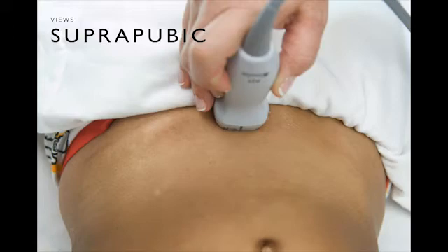So I add in this because I had mentioned this briefly when we talked about the cases yesterday. I wouldn't solely do a Morrison's view in a kid. So even if a kid has a liver laceration or splenic rupture, they may not have fluid in the right or left upper quadrant. So this is important to know. We think that it's probably before puberty is the cutoff. With puberty, the anatomy of the pelvis changes, so that might be the reason why. But we found that suprapubic view is helpful in prepubertal children.